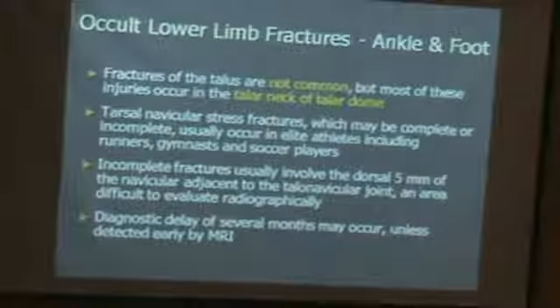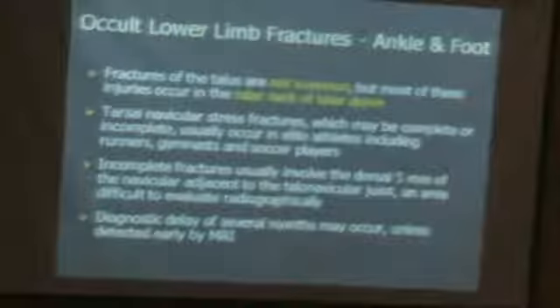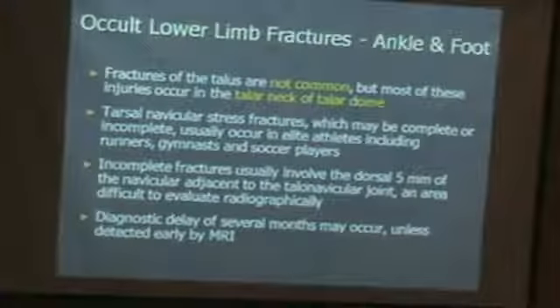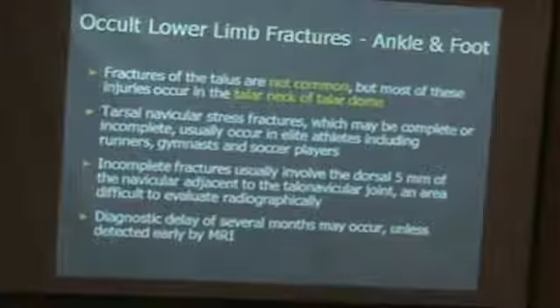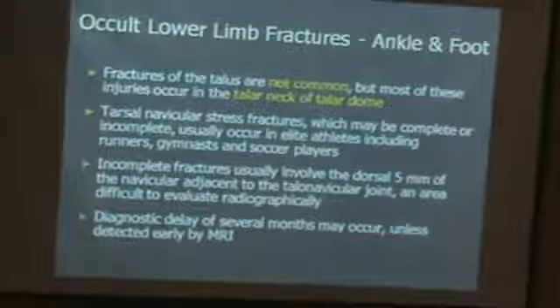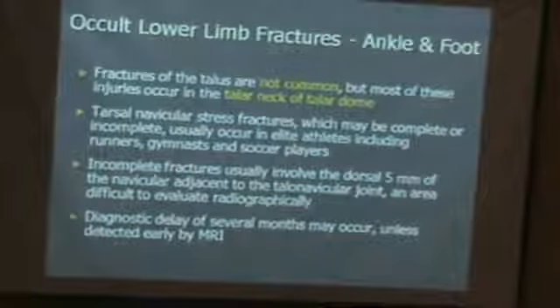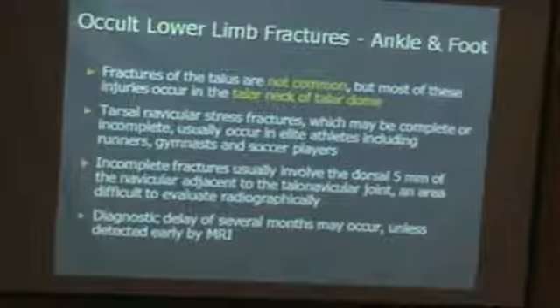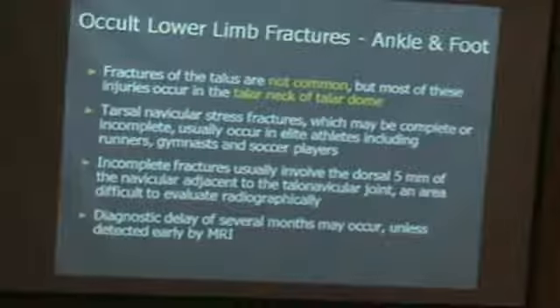I will finish with the lower limb and fractures of the ankle and foot. I will say that the talus, in the neck and the dome, is where you find the maximum of occult fractures. Of course, the calcaneus is one that fractures a lot, but most of the time we see it on X-ray. We see that change in the angle, so we see the calcaneus fracture very well on X-ray. We do CT because we want to see surgically how we're going to deal with it, and if it's intra-articular or not.